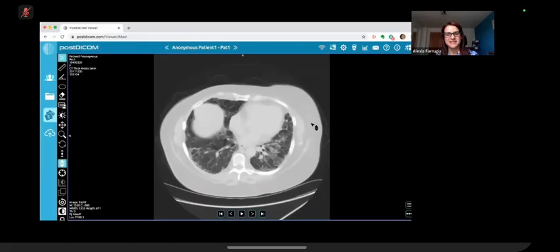Yes, that's exactly right. So this is the head cheese sign, actually, for chronic hypersensitivity pneumonitis. So we've got three densities here. You've got ground glass, you've got normal lung, and you have these areas of air trapping. So there's a mosaic attenuation pattern, and there's these three densities. Okay. Well done.